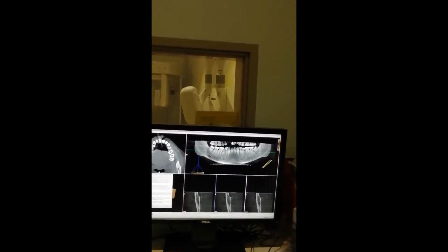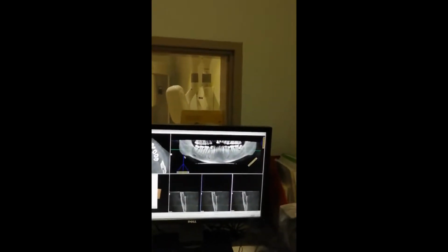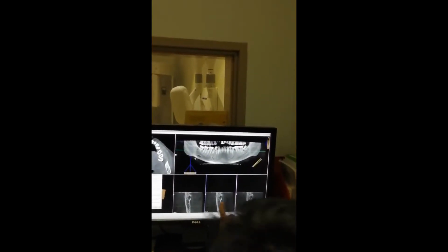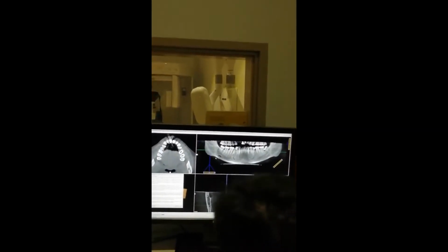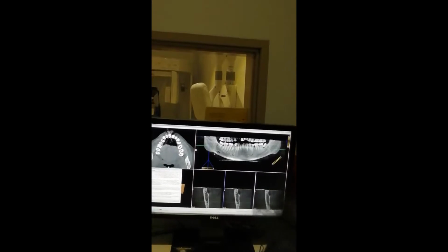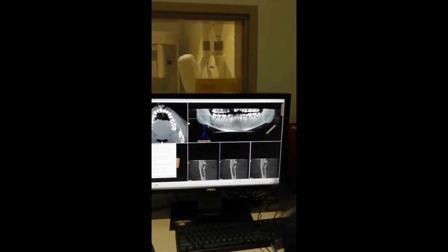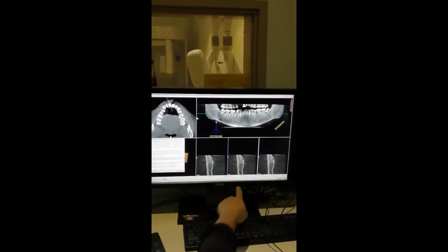Actually it is at the edge. We are not taking the full area, right? That's why we can see this. See, the entry is already made now. Okay, this was the opening actually. See, from here it was entering. Correct? There is no bone here. There is an opening there. So from there the entry is already made, and see, now it is confined. Now it runs through the mandible, down like this.